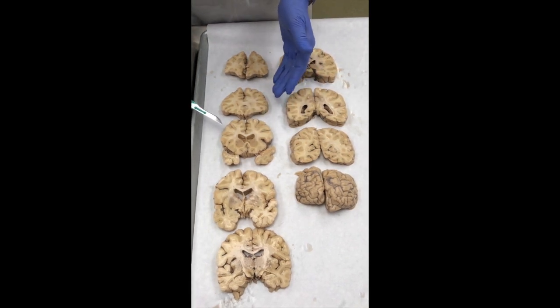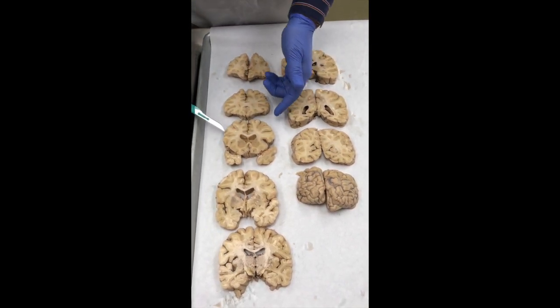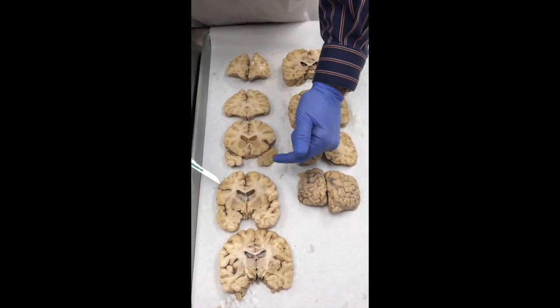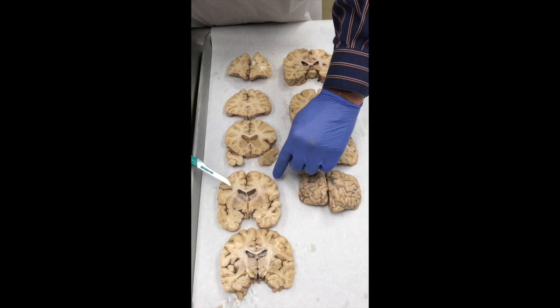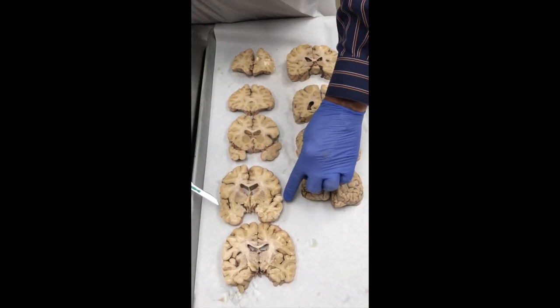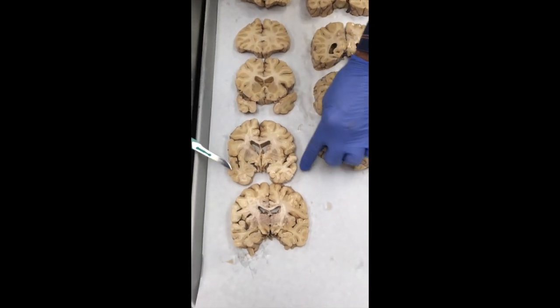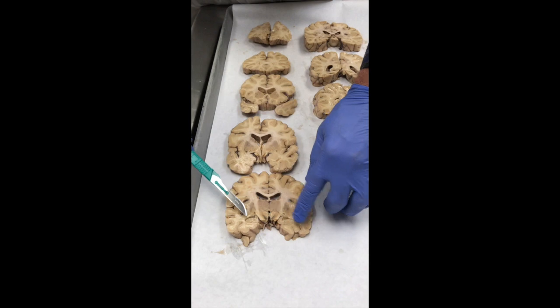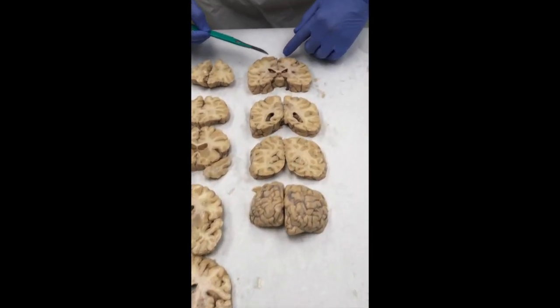to be a bit difficult and subjective because there's going to be knuckle cuts of the individual gyri as we go back. But in any case, looking for infarcts, which tend to occur in the depths of the sulci and would be manifest by the loss of gray matter. I don't see any evidence of infarcts there. Looking here, that looks good. We're going to talk about the ventricles in a moment when we come back to those.